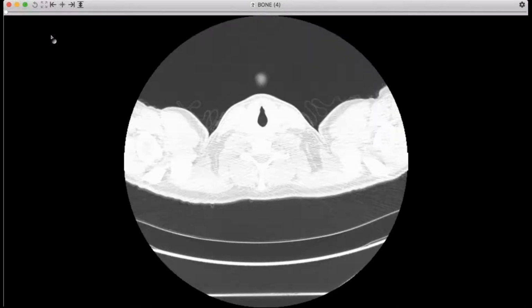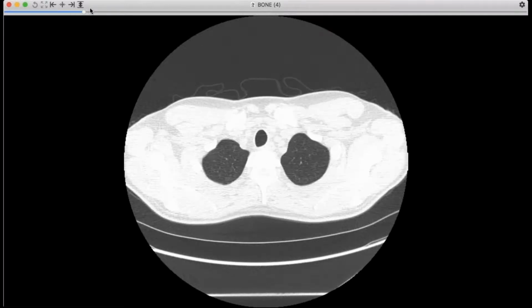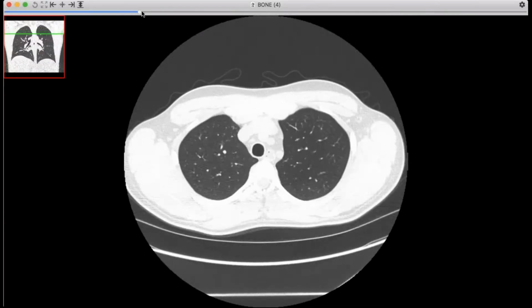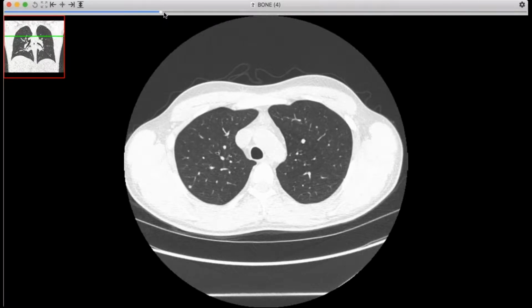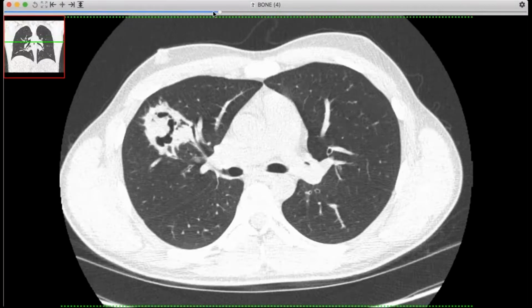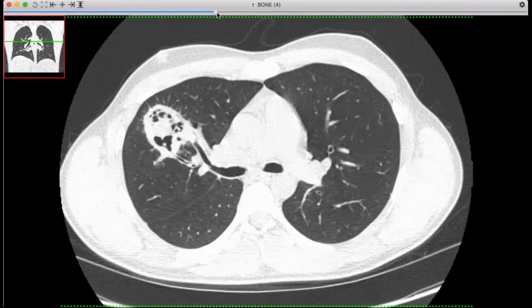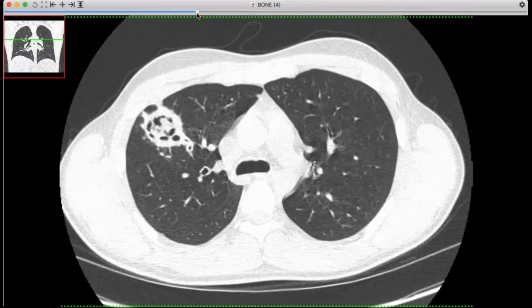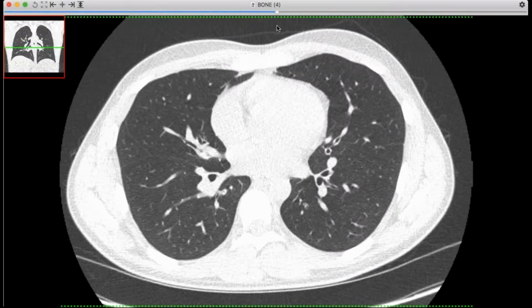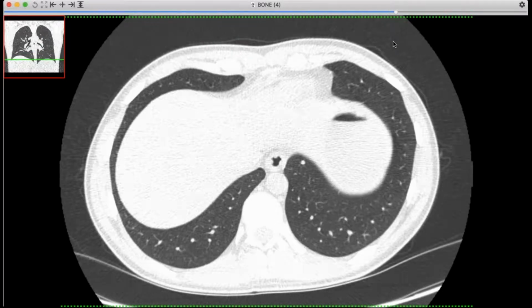And he underwent a CT scan to further evaluate said mass. And you'll notice early on we see several really well-formed nodules. Got one here. So very well circumscribed nodules. And then here's the mass in question, and it's got a very thick wall, a lot of internal debris, no real fluid level. And again, some more well-defined nodules that are just kind of randomly distributed.